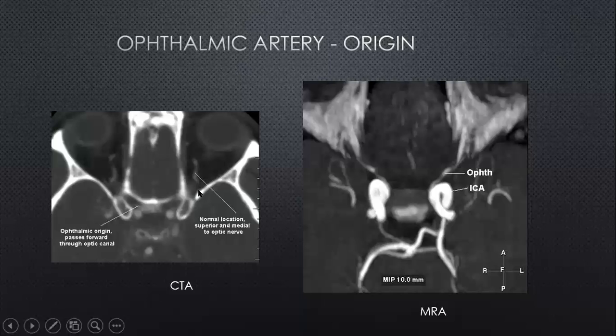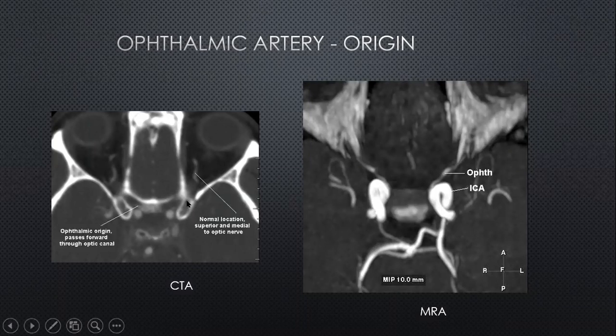And of course you have a CTA, but you can see it also on an MRA. On MRA it is difficult to identify the clinoid processes clearly unless you're used to seeing them, so if you're contemplating any surgeries around this area, it is vital to look at a CT picture of that region.